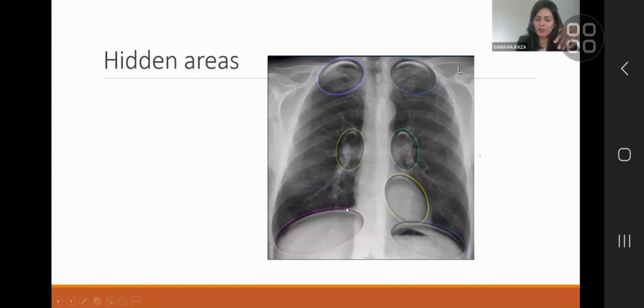Almost all of us in the beginning can perceive that, oh, the lung's finished, and not realize that there is lung there. The lower lobe is lower, the posterior part of the lung is lower than the front part. So there is lung behind the diaphragm on both sides. On the very rare occasion, you will see high density lesions there, and then the question will be, is it in the lung or is it in the liver? But it's important to review that area.